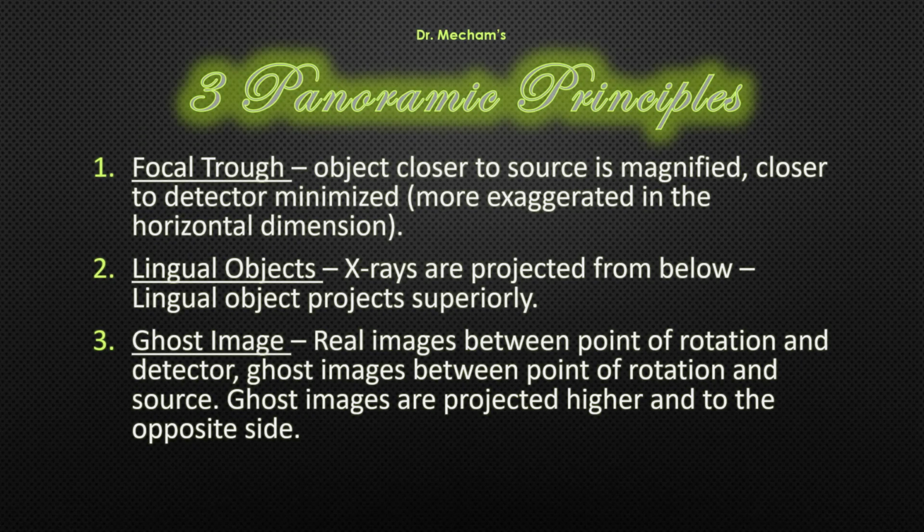All right, these are my three panoramic principles that you need to understand how geometry affects panoramic radiographs. In the previous video, I already talked about the focal trough, so go watch that one if you hadn't already. And this one, I'll cover lingual objects and ghost images.